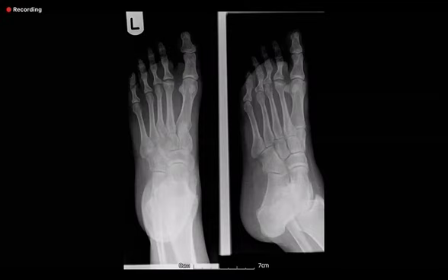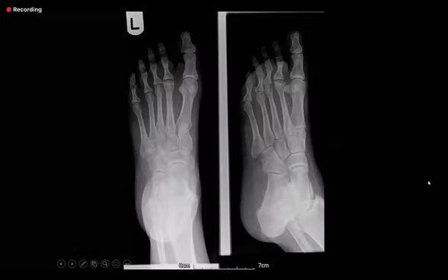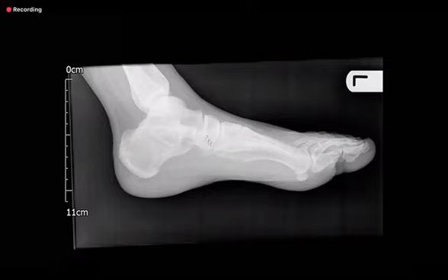Did you pick up, let's say, on this one, there's another finding. Is that right? The C sign. You're talking about this thing. Sorry, for some reason on my screen I can't see the pointer. Okay, what I will do is I'll take the control from you, because I think it's giving us problems. Okay. So now, yeah, I can see it. Now, is this thing the C sign you are pointing out?